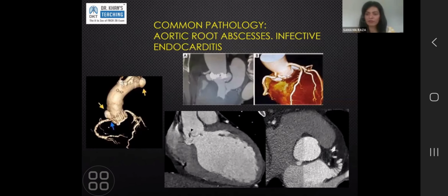So you may have an IV drug user, you may have post-surgical scans, you can have post-trauma, even iatrogenic trauma. Somebody went into the aorta to do some procedure and they ruptured it. They left it alone because the patient was well, and weeks to months later it created a small pseudoaneurysm. A pseudoaneurysm on axial scrolling, when you're doing it quickly, can go missed. If you just saw that image, you'd say, oh yeah, that's the left main coming off. But it becomes more evident when you put it into a sagittal or a coronal or an LVOT view.